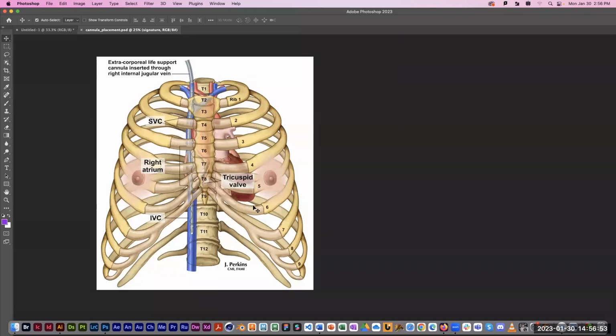We've got the apex of the heart, which usually sits in the fifth intercostal space, which it's in the fifth intercostal space down here between ribs 5 and 6. The arch of the aorta sitting right back there at the sternal angle, which lines up with T4, and left and right brachiocephalics joining together to form superior vena cava, and maybe a teeny bit high. That's a little bit above T4, but it's pretty close. And then there's some other anatomic relationships there too.